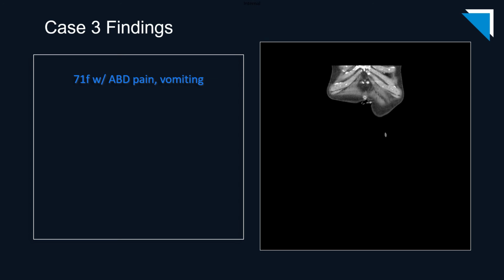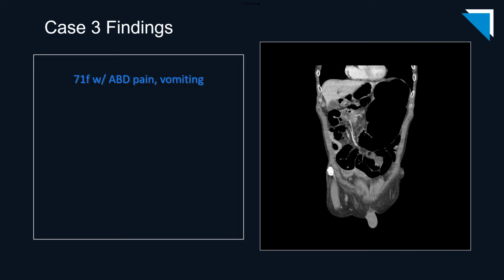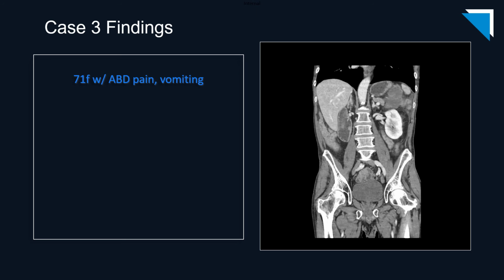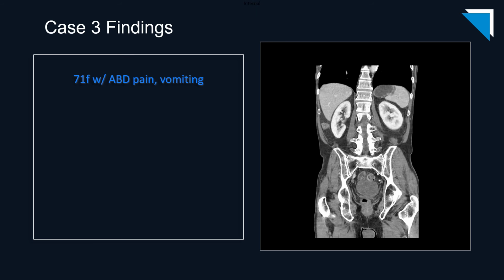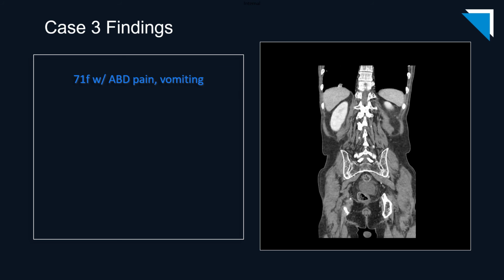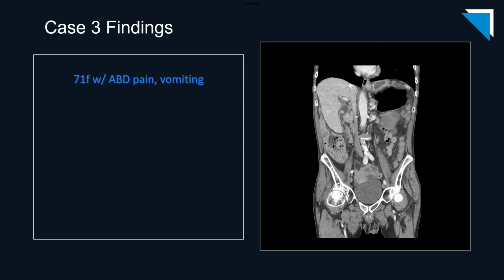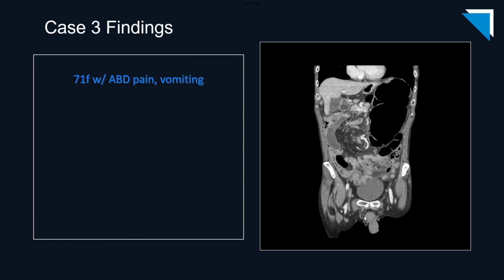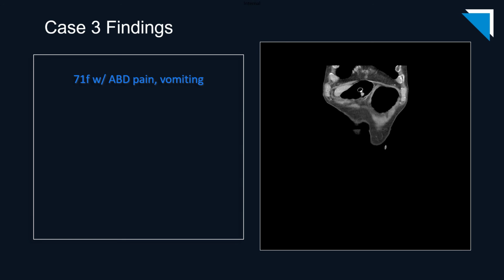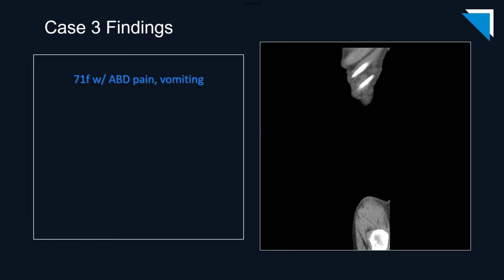Here are the coronal images from that study, and the sagittal images.